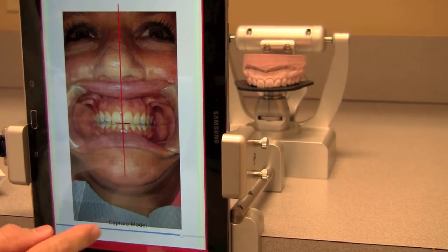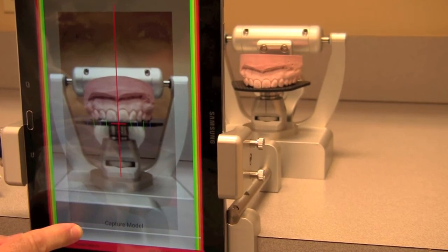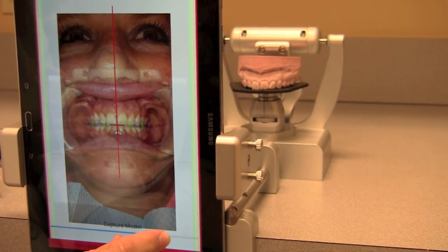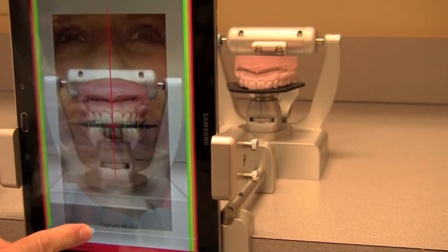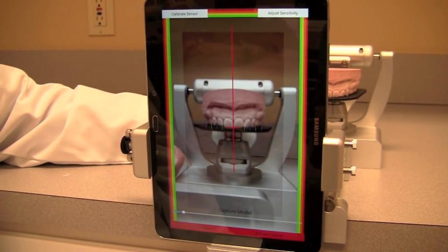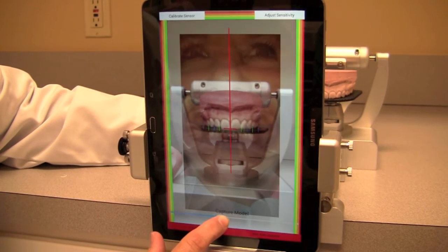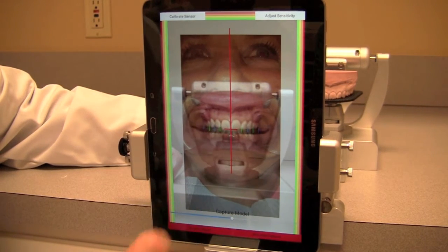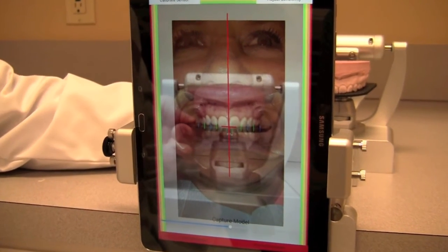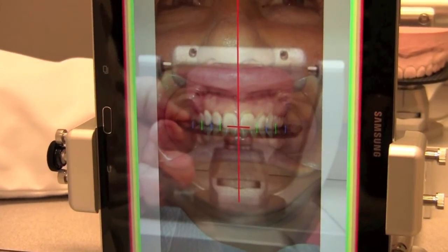And we utilize the blue capture bar to compare the two images. It's easiest to move the blue capture bar midway, and then using the mounting stand's 20 degrees of motion, work to align the images.